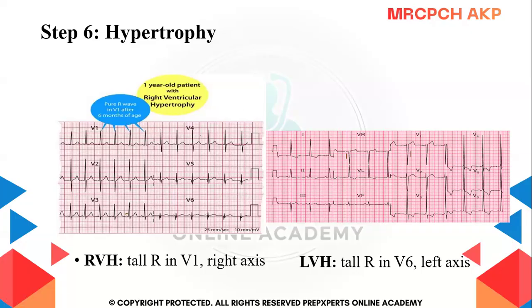The first step of the ECG that I mentioned is not really relevant for the exam point, but from the rhythm part, just go through the rhythm, regular, irregular. Then you have to go through the rate. Okay, what is the rate of the ECG? You all know by now how to calculate the rate, whether the rhythm is regular or irregular. Just have a look whether it's sinus rhythm or non-sinus rhythm. Okay, then you go to the axis. You have seen the axis, whether it is left, right, or normal axis.